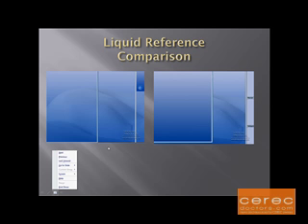Time is of the essence. If we want to get in there, we want proposals, we want a mill. Liquid Reference from dentalcadproducts.com will help you get there.